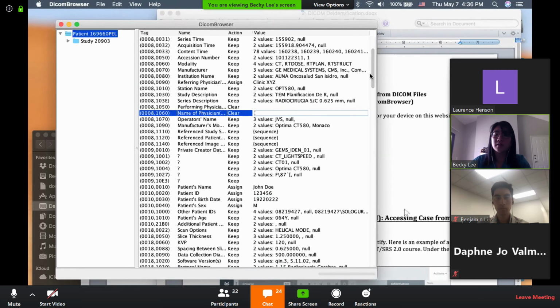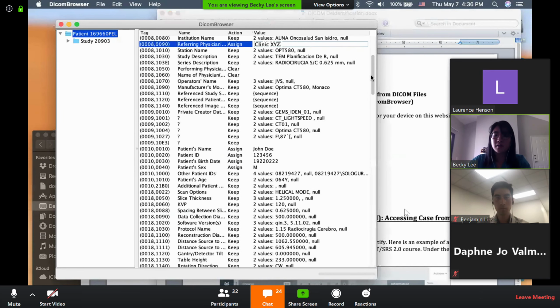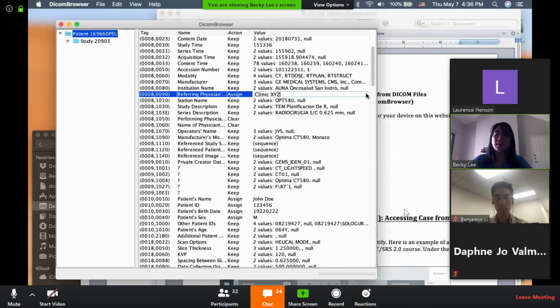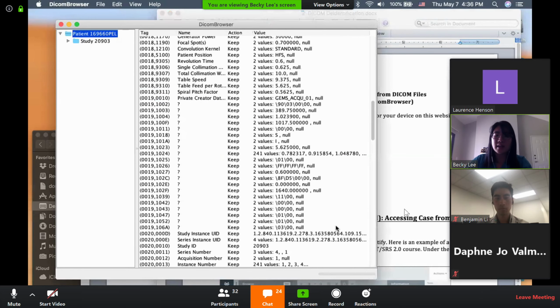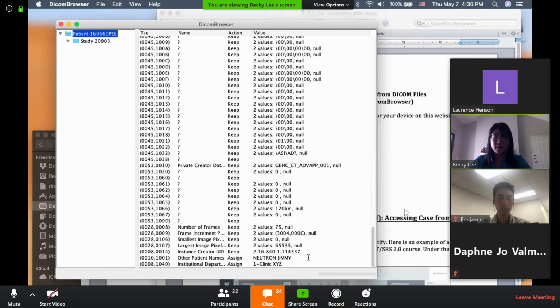Or if they have the name of the clinic, I actually went ahead and cleared that as well. So here I cleared out the clinic that was originally here, and I just named it Clinic XYZ. And so once you do that, you're essentially just anonymizing everything that can be linked back to the patient. And I actually go through and just make sure that anything that can be tied back to the patient is cleared out. So here again, you can see that I have the patient's name. So I'm going to go and change that. And you can name this whatever you want. It could be a number, it could be a made up name, patient 1, patient 2, and then I changed it to clinic XYZ as well.